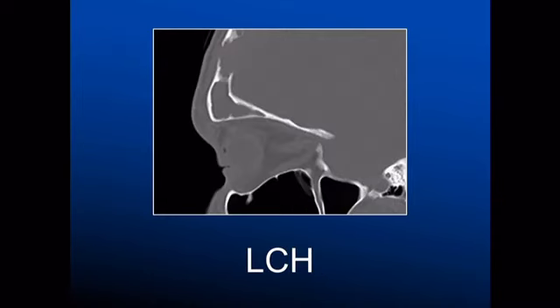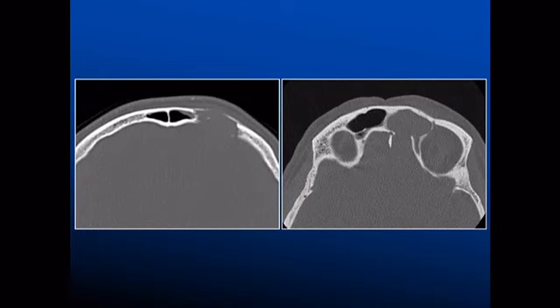I might skip forward this one. That was a nice case of an LCH, but I just wanted to show this. So this is that LCH case, and you can see on this one, there's the aggressive bony erosion as opposed to a mucocele where you have that thin, smooth, bony expansion.